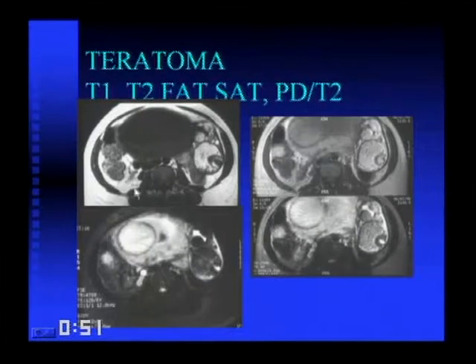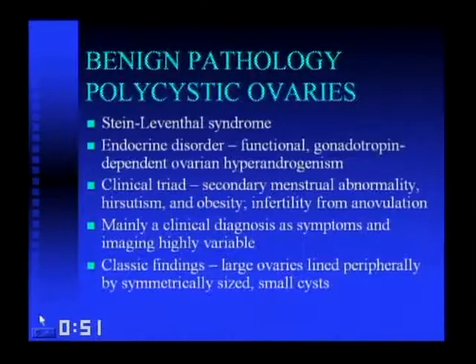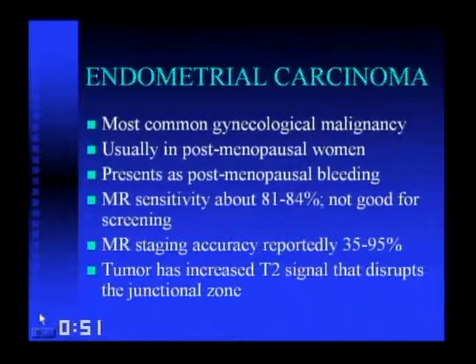It was a teratoma. I'm not going to go into polycystic ovaries because this really isn't an imaging diagnosis. While there have been classic findings described, you hardly ever see them, but I'll leave that to you reading the notes. Endometrial carcinoma is something you can see with MR.